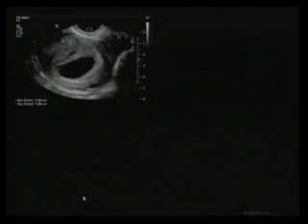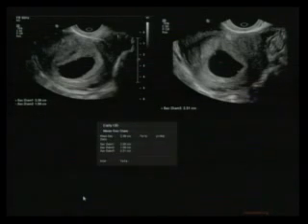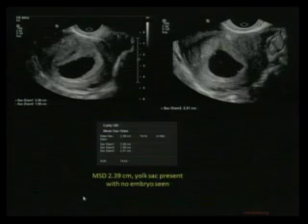All right, so here's an example. It's a very large gestational sac. Nothing inside it. By this size, you should see a fetal pole. There's no fetal pole. There's no yolk sac. It's the same patient, different dimensions there. So mean sac diameter 2.4 centimeters, yolk sac. Maybe this is the yolk sac. This is from the literature. I guess that's a yolk sac there. But again, this is big enough. You should see an embryo because we're greater than 25 millimeters. There's no embryo in this gestational sac.